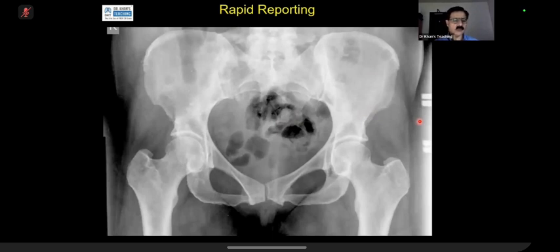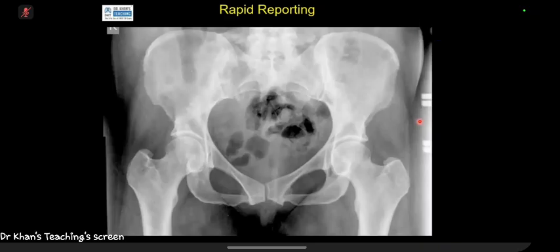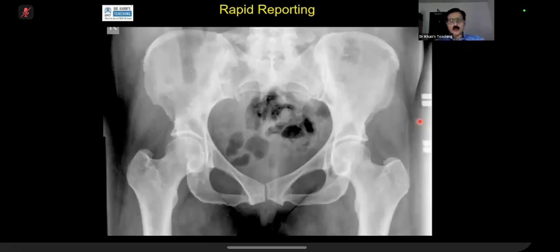Okay, normal, abnormal, candidate 2. Normal or abnormal? Okay, let me check. Let me open it for the chat. Normal or abnormal, I'm looking at the answers. If it is abnormal, give me the finding. So it is open for the chat also. But candidate 2, if you pick up the abnormality, just tell me. I will not take abnormal as an answer.